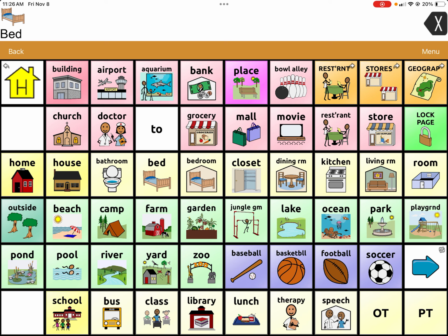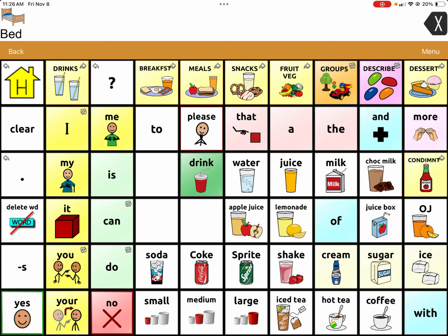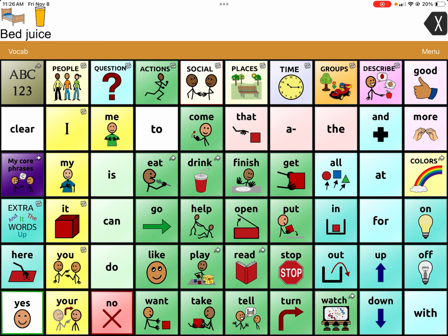And so there's a similar one for eat and drink. I'm thirsty for. So this is my voice, so pretend it's not even related to a song. Juice. So you can say I'm thirsty for juice. So that's a stage 1 similarity. That can also be a stage 2 because it's kind of mixing and matching.